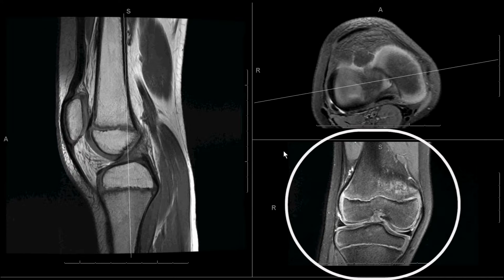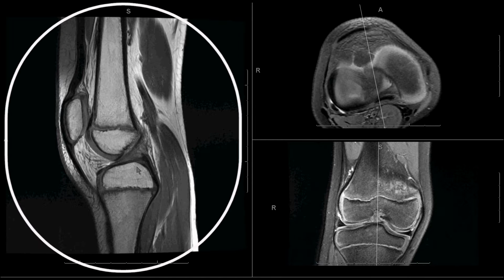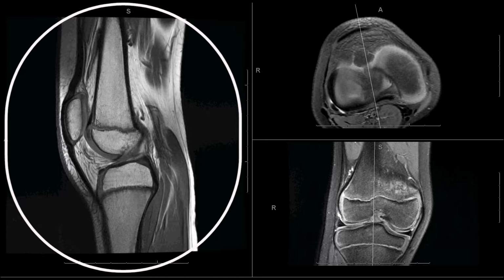In the younger children, we'll also look for the tibial spine and look for evidence of a fracture of the tibial spine, because in those before the growth plates are mature, you're going to have the highest risk area, or the weakest area of the knee is where the ACL originates, which is at the tibia, and that's the tibial spine. So a tibial spine fracture may be what happens with an ACL tear, and the ligament itself might actually be intact.